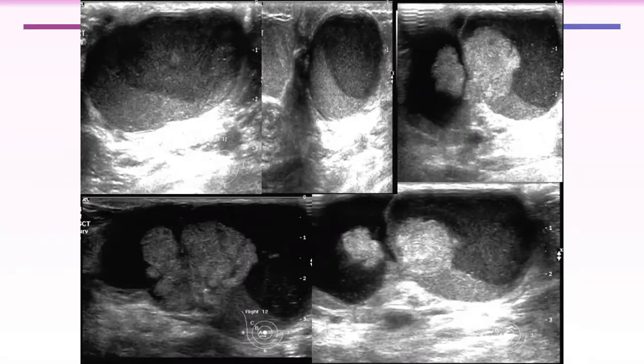You cannot see it all to tell if it is circumscribed or not, but at least there is a complex cystic mass with a portion with a solid component. Look at this projecting solid component. It even contains the microcalcification you have seen in the spot magnification. It looks malignant. Flower-like appearance.